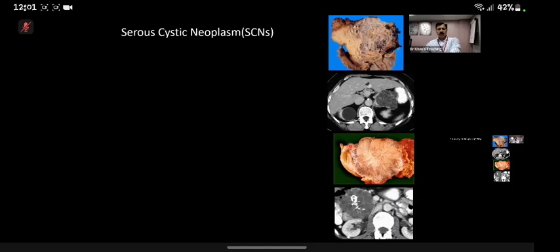So, now, what are the take-home points as far as serous cystic neoplasm? If you see, first of all, these pictures, you can make your radiology from here. First of all, a disclaimer is that in the real world, at times we cannot discriminate between the two. But if you see a classical picture, the examiner has to show you a classical picture for you to be able to pick that up. Now, this picture tells you everything, that it has got multiple small cysts.